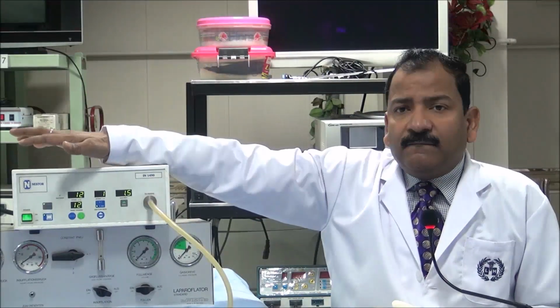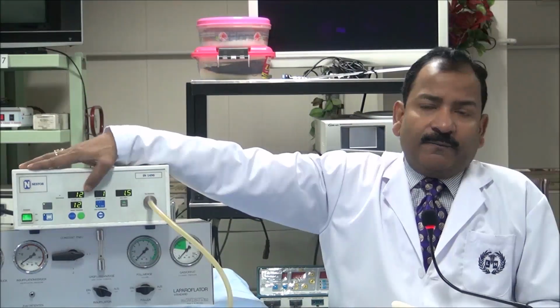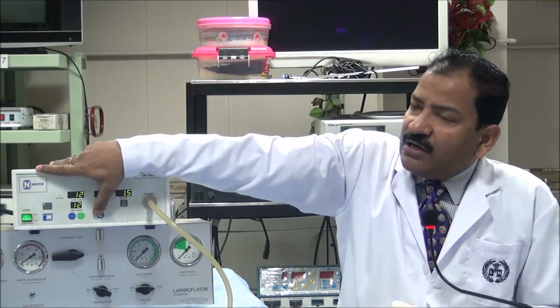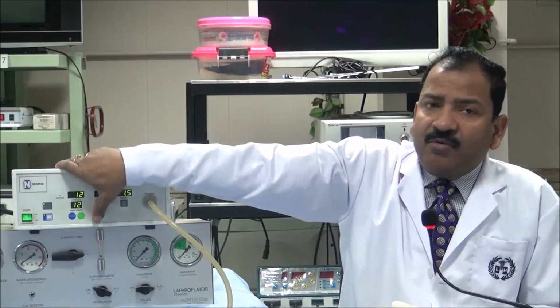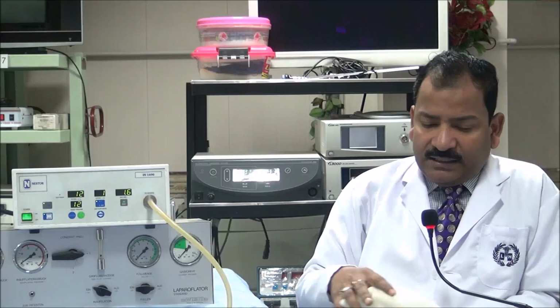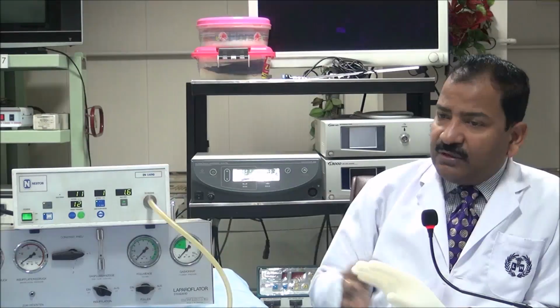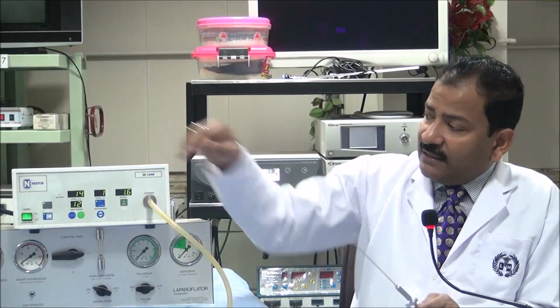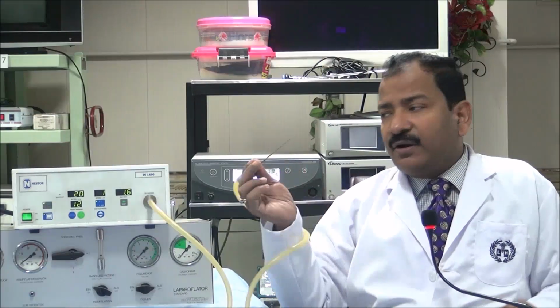Now, there are two types of flow. This is the flow rate. One is Veress needle mode, another is cannula mode. When you use the Veress needle, you put it in Veress needle mode and attach the Veress needle, and then you start the flow.